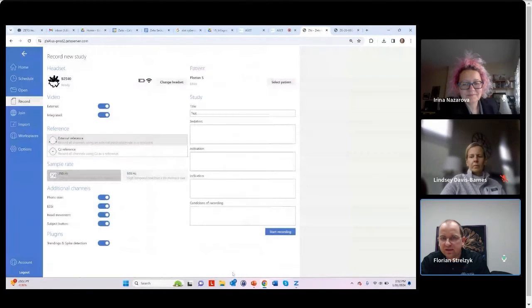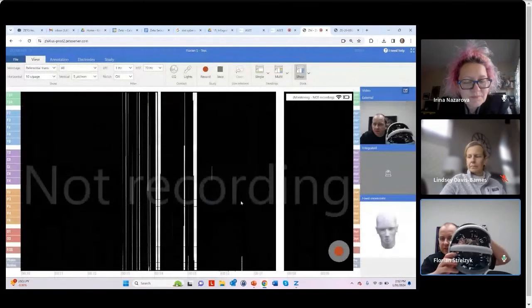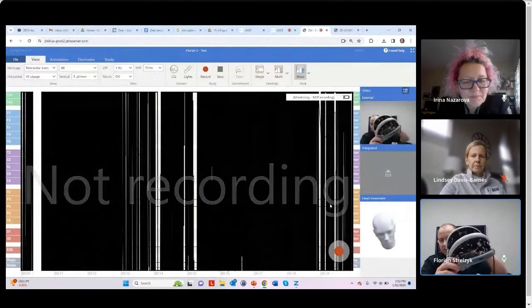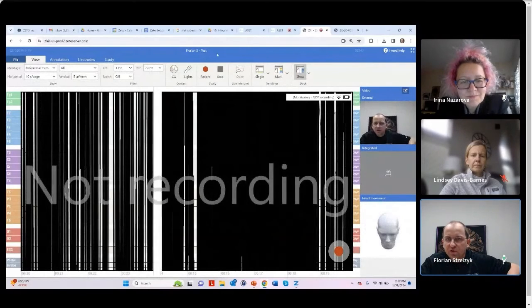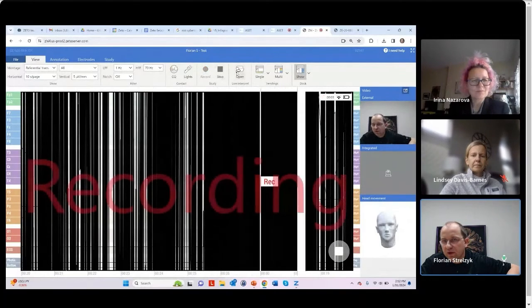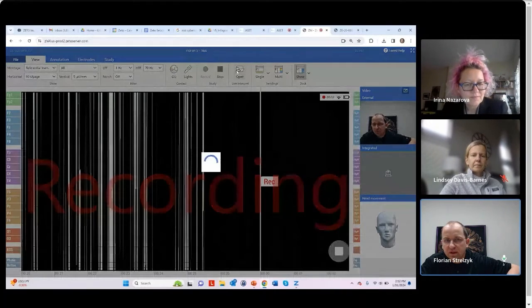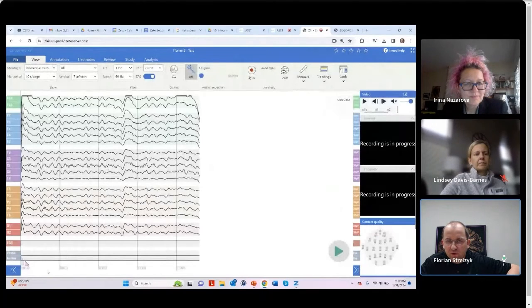This is my headset now, and if I now hit record, so now you see as I'm moving the headset, it starts streaming data. It's pretty straightforward. During this, we have the ability to go to a scrollback mode. We've talked about that. We can review data that you've already recorded. Here, I had only hit the record button for 4 seconds.